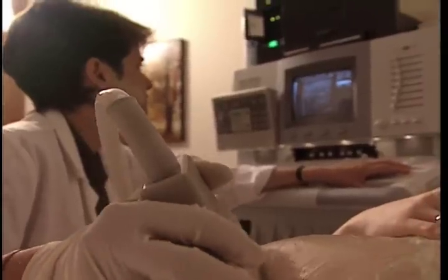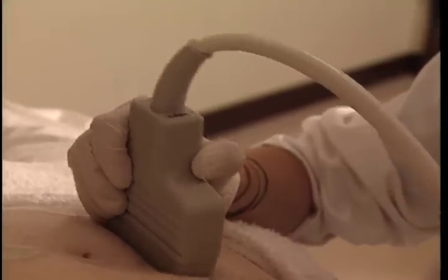We also look at the spinal lesion itself, and we determine whether there's a sac covering the exposed nerves, or it's just an open lesion. Sometimes we call that a rachischisis. That just means there's no covering sac over the defect. And we determine the upper level of the lesion with sonography. We have a few little tricks to determine what is the highest level of the lesion, which seems to be pretty well correlated with motor level of the lesion after birth.